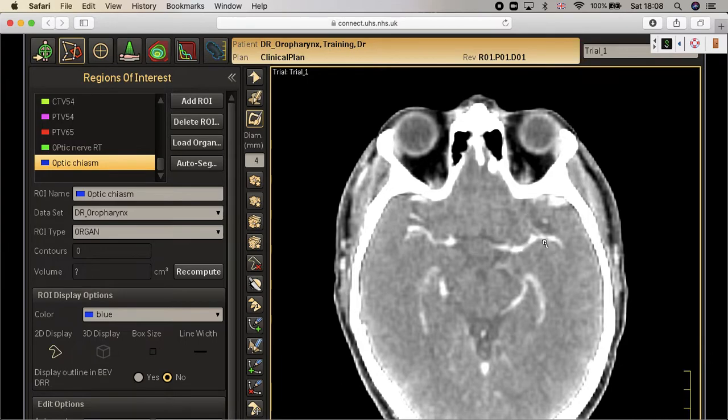And this is the largest fissure in the brain. If you look at it, as we are looking at it, we say it's the mustache sign of the brain. We look at it as if there is a mustache for the brain. And here, for example, I'll show it to you. So I'm calling it the smiling face. So this is the cistern, and this is a smiling face for the brain.